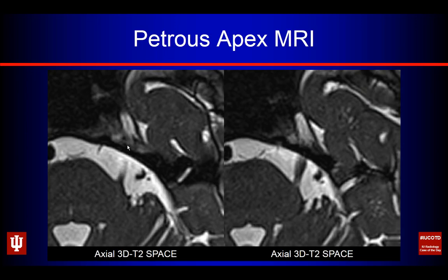What does it look like on MRI? Well, there it is, sort of this pyramidal shaped thing at the anteromedial temporal bone. And I think you can sort of get a nice appreciation for some of the adjacent structures here. So we've got our trigeminal nerve working its way up into the trigeminal or Meckel cave. We can also see cranial nerve 6, the cisternal segment. Here's that abducens or Dorello canal. So you can just appreciate we've got important cranial nerves, 6 and 5 that are right here. We also have the carotid artery, which is obviously an important structure that can be involved by pathologies, and so you want to let the surgeons know about that as well.